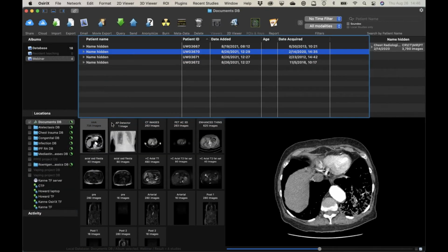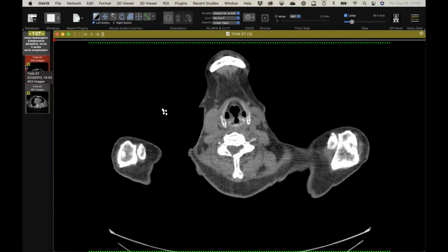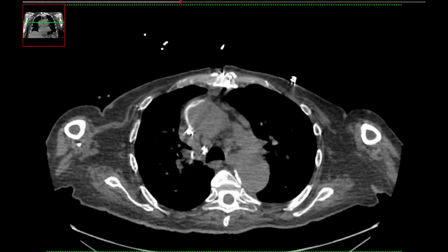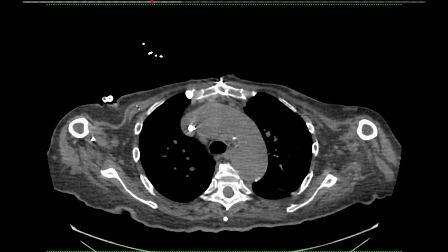Alrighty. Let's see, I'm going to do that one next. So I'm curious what you guys think of this. This is one of these surprising cases. This is a patient who had a heart transplant about a month before the CT, and he had ischemic cardiomyopathy, and it was complicated by graft dysfunction. So this is a month out.